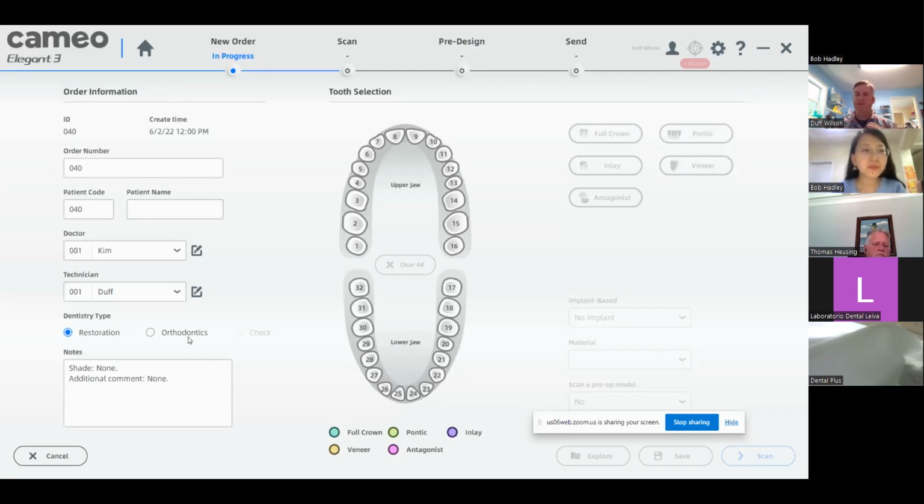It actually will present a mock-up, and this is a cool feature, it will send a QR code, one of those codes, to your phone, and you click on it and it'll give the patient the mock-up ideas of what you've come up with, or you can share them with your patient in the office.